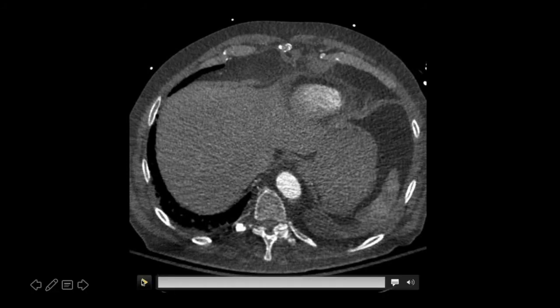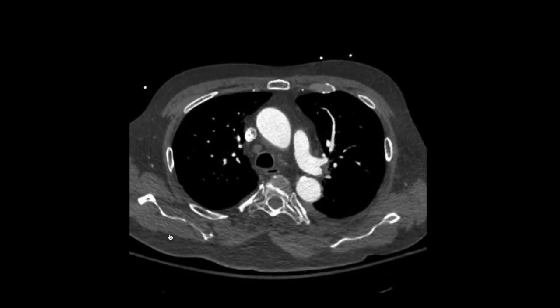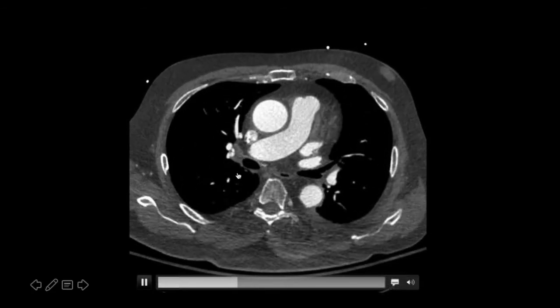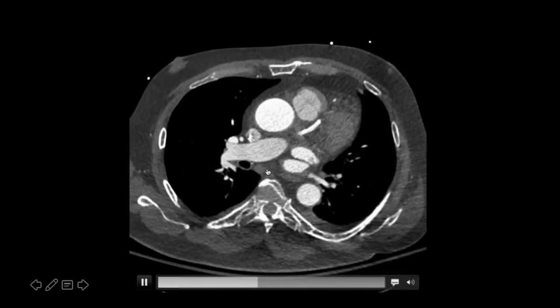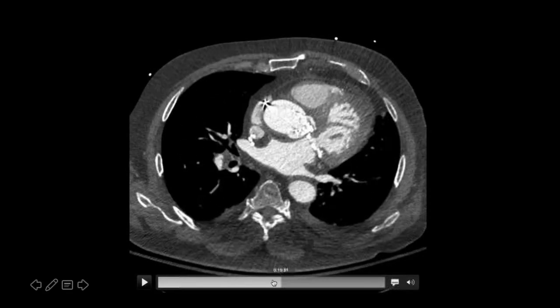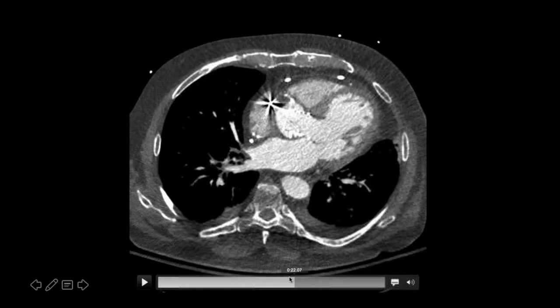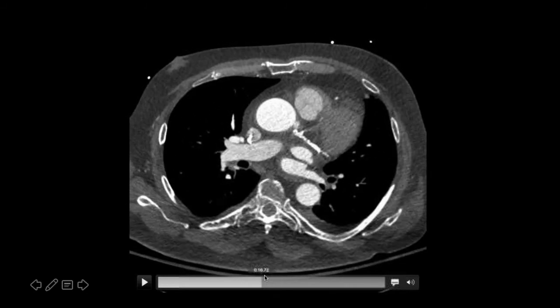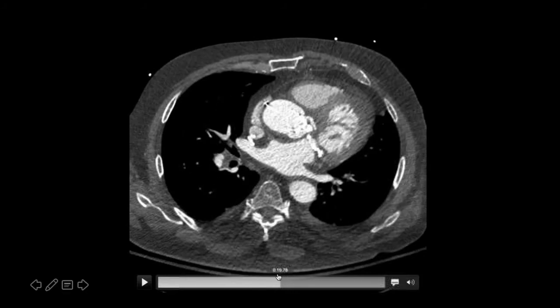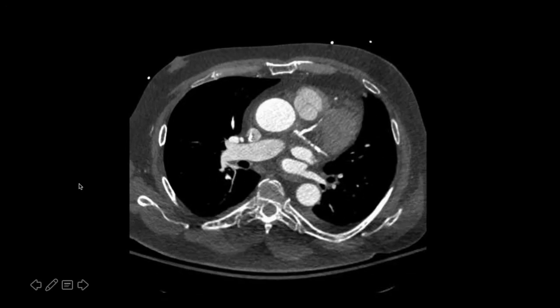And I must say, initially we walked by this because we were looking for more of an aortic dissection as opposed to what this turned out to be. We haven't seen too many of these. So I'm just going to scroll back and forth here and ask if anyone is seeing some contrast that doesn't belong. So I'm glad it's not jumping out at all of you.